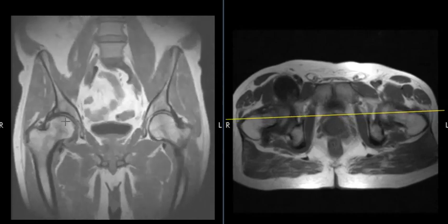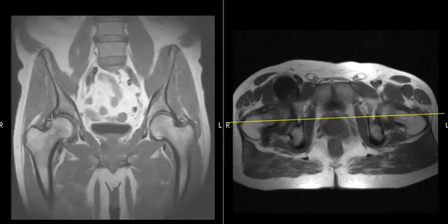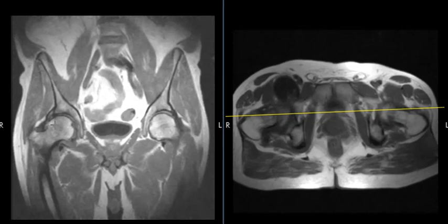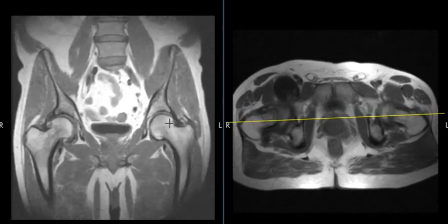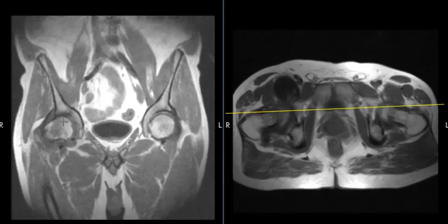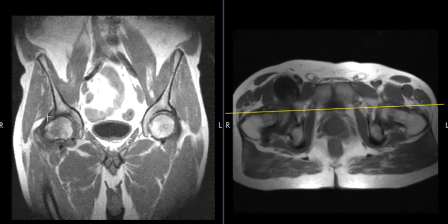And on the right hand side, we see that the femoral head is not round. It's flat on the upper outer side, broad. And we see that if this right femoral head rotates, this broad area is going to pinch into the acetabulum here. Up here on the left side, if this rotates, it's just going to rotate nice and uniform in that cup. But on this side, this broad area, like a cam, is going to go up here and pinch this tissue. And this patient does have an abnormal signal right over here.